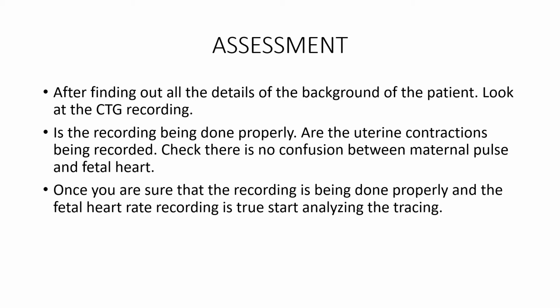Check if there is any confusion or any similarity between the maternal pulse and the fetal heart. Maybe the fetal heart is not being picked up and the maternal pulse is being picked up and recorded. Once you are sure that the recording is being done properly and the fetal heart recording is true, start analyzing the tracing.